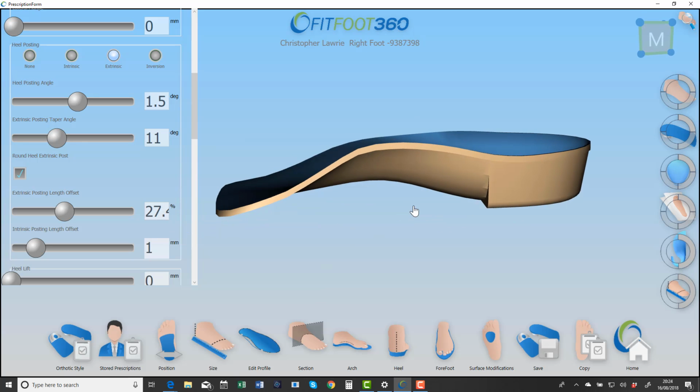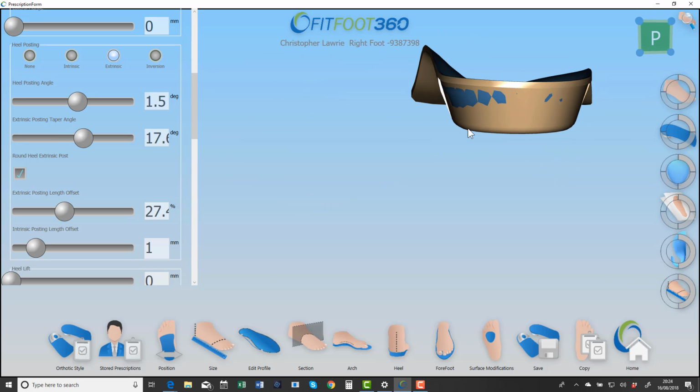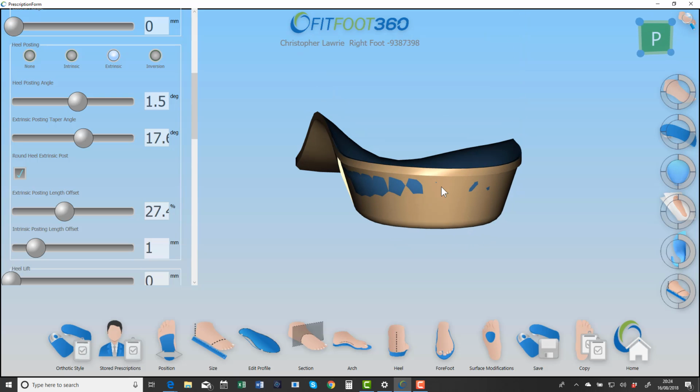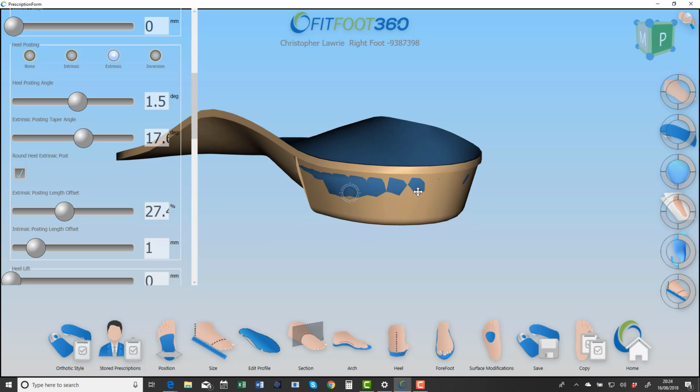Okay, you might want to do something like this if you're 3D printing as well. So you can put a very big taper angle on there. Oh, by the way, note, this is just pure geometry, if your taper becomes bigger than the inside clinical surface of your device, it will tell you by making it blue. This is not good.